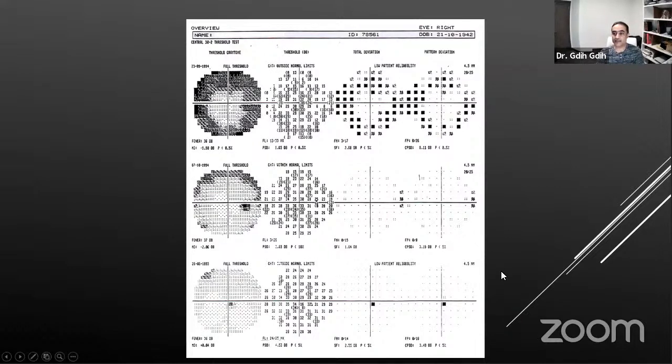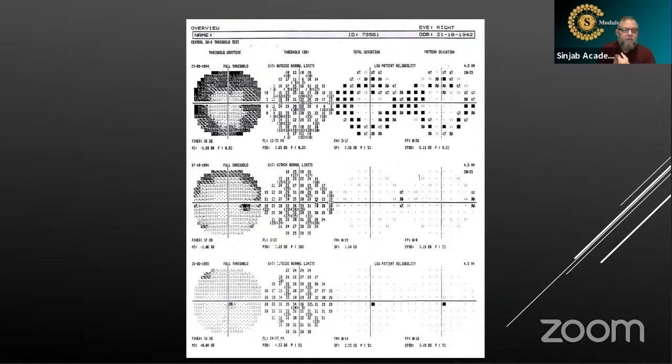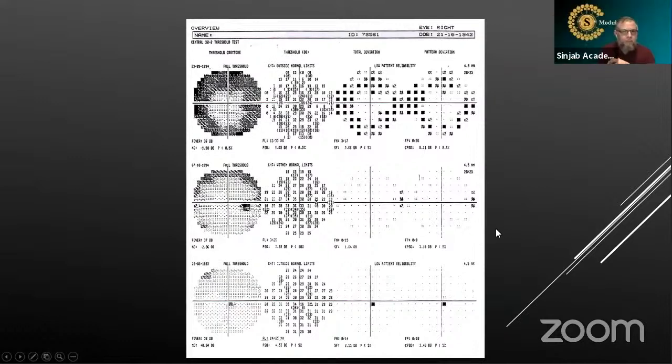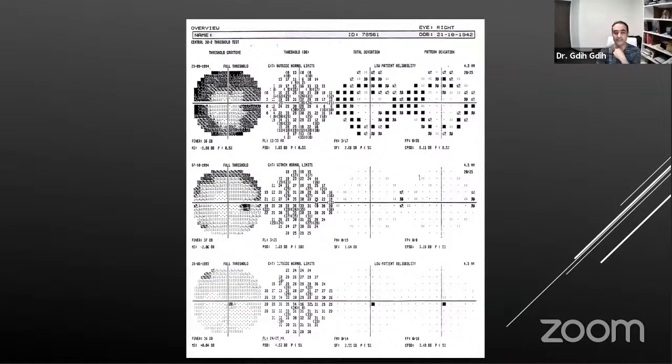So there is something. I think this annular scotoma is related to spectacles or something. No, there was no spectacle. The patient was fine. Just because the first time it didn't make sense, a doctor decided to bring them back again. Maybe the patient was taking pilocarpine? No, every other physiological factor was tested. It was good.